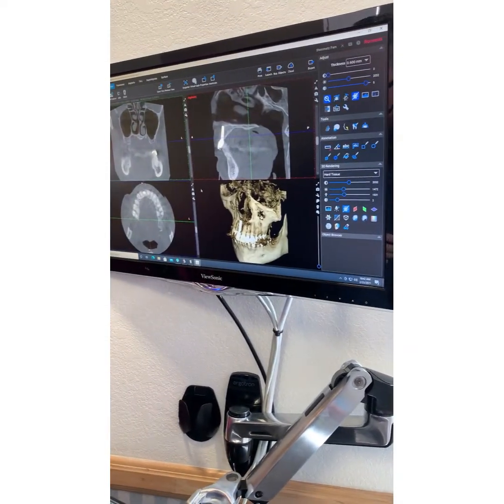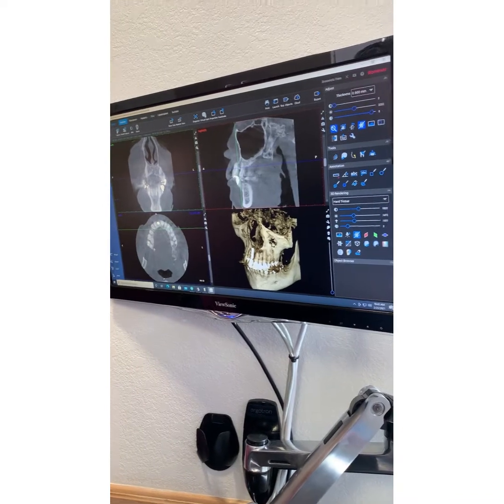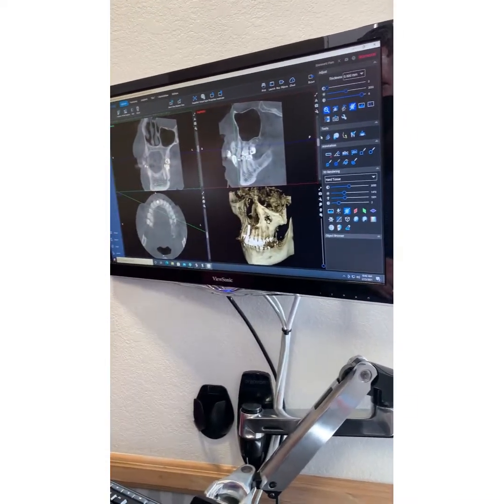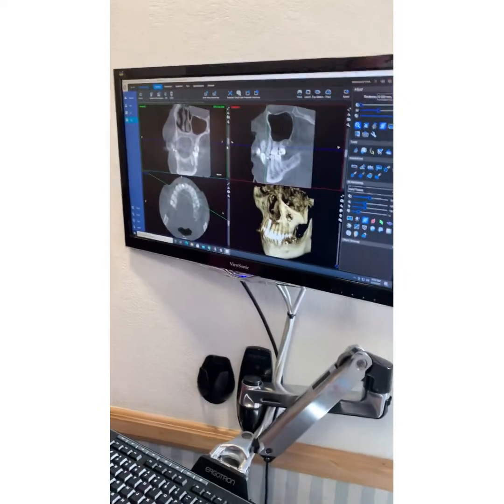But when you turn this off, let's say I want to start creating a pan. I'm going to move my X and Y axis over to one side, and then use the right mouse click to move this. Now I can start seeing stuff, and I can move this right through. That is so cool. Look at this right here. I just showed that perfectly.